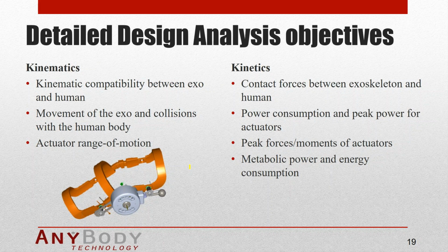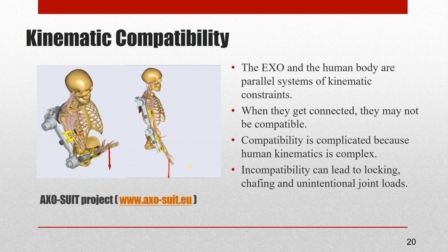You can also calculate power consumption and peak powers for the actuators. This is important for dimensioning batteries and also the actuators themselves. Similarly, with peak forces or moments of the actuators. And finally, as we saw before, we can compute metabolic energy and those kinds of things depending on the design of the exoskeleton. Let's take a look at a couple of examples.